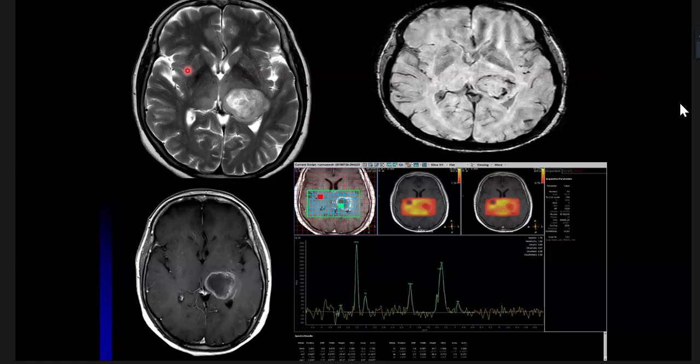We have something which is heterogeneously hyperintense, showing blooming again on the periphery, with thick irregular wall enhancement, surrounding edema, mild mass effect, and significantly raised choline peaks when the cursor is placed at the level of this peripheral enhancement. So possibilities of lesions like inflammation and infections are ruled out. We have come to the conclusion that this is a neoplasm. What are the neoplasms sitting in the thalamus, considering this patient's age is 56? Glioblastoma, high grade.